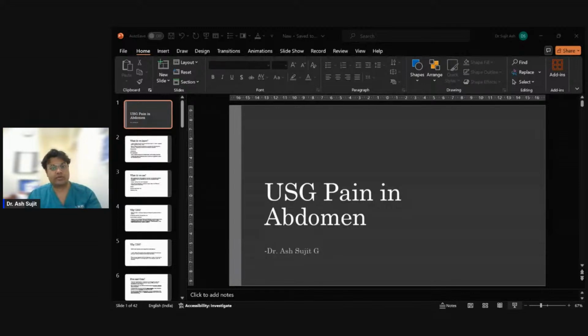So this is how you should remember when differentiating follicular cysts versus corpus luteal cysts on sonography. Even when you try to operate, at times you might get a patient with pain in the abdomen and a huge hemorrhage. Follicular cysts usually are simple and do not have any vascularity, whereas corpus luteal cysts will have vascularity. So this is what you see again.